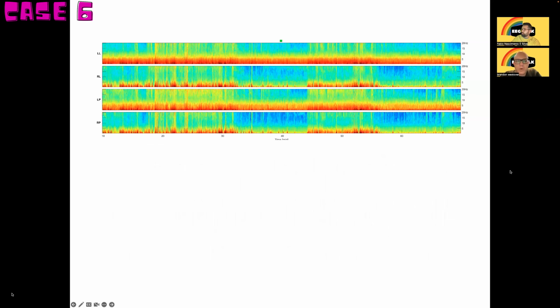Gotcha. Okay. Next. Oh, this is different. Something different. All right. Let's take a stab at this. So more on the left. So the first focal guess on this episode. So more on the left. So focal, whatever it is, it's focal. Now looking at the band, it's still broad.